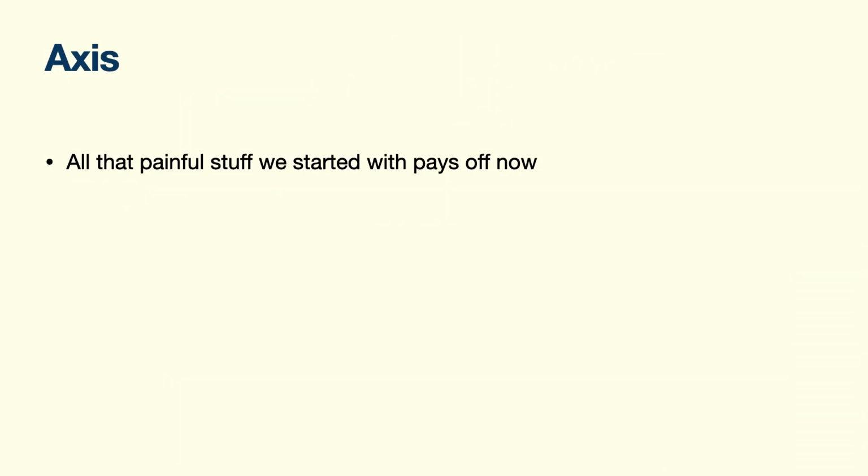All right, axis. You've heard about axis. What is it? How do you figure it out? Well, I think that the painful part of learning the leads actually helps with this part. I've heard a lot of different ways to read axis. I think my way is the best. I know that comes as a shock probably. But I look at leads 1 and AVF first, which gets you most of the way there.